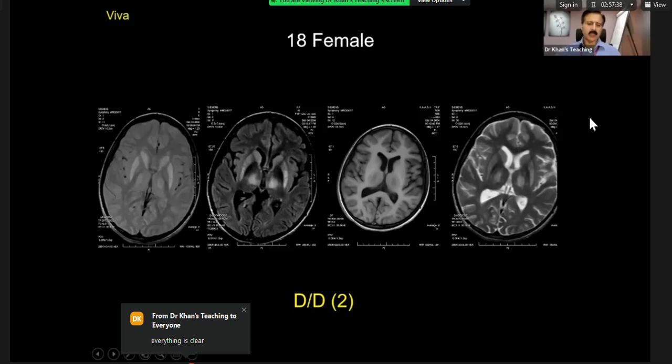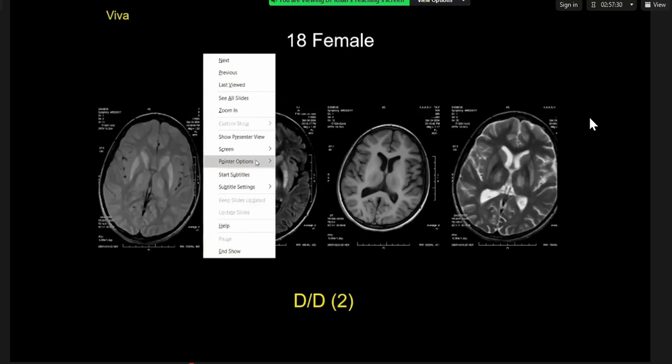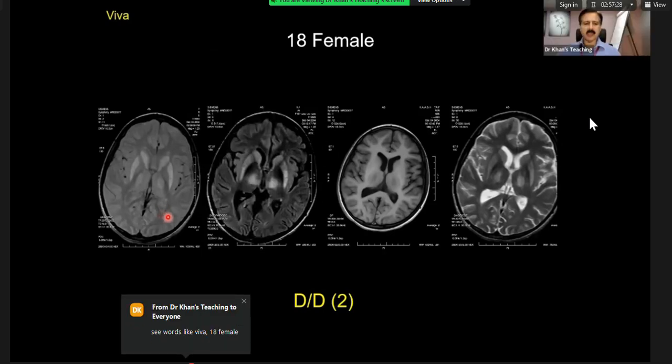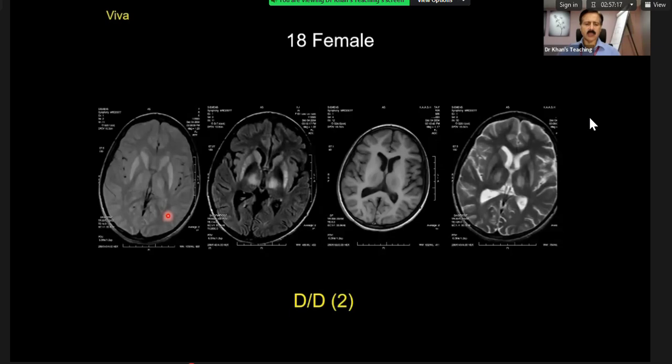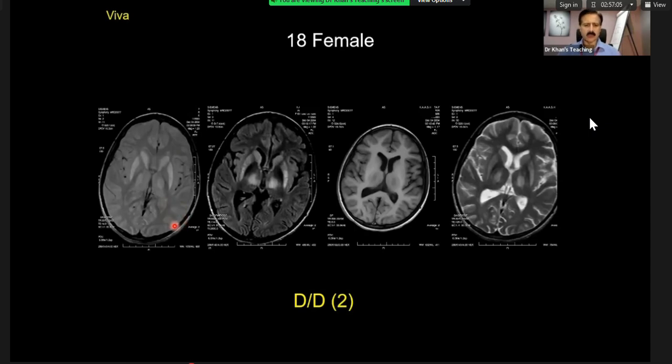Okay, fine. By the way, you called it a SWI? Yeah, is it T2 style? So this is a PD weighted sequence. And on a PD weighted sequence, please remember that the CSF is equal in signal intensity to the gray matter. So the vessels appear as a filling defect. And as I told you in the beginning also, PDs are out of fashion these days. But having said that, this is a PD weighted sequence. So PD, FLAIR, and a T1.